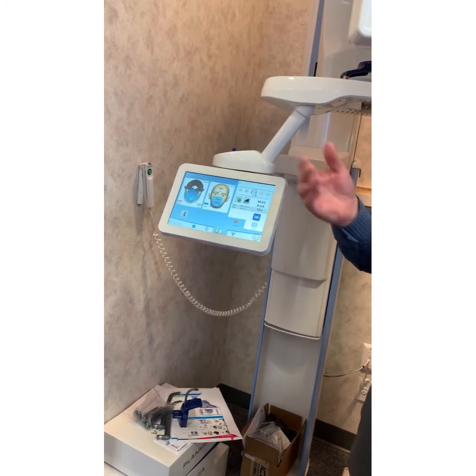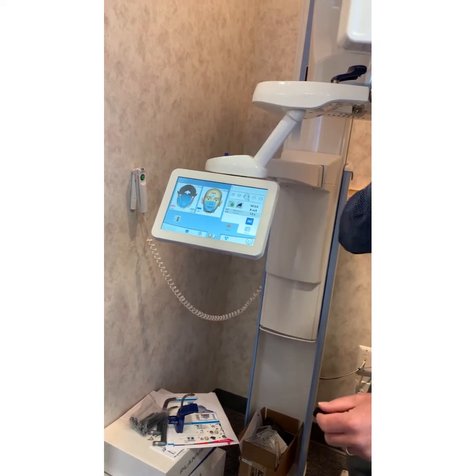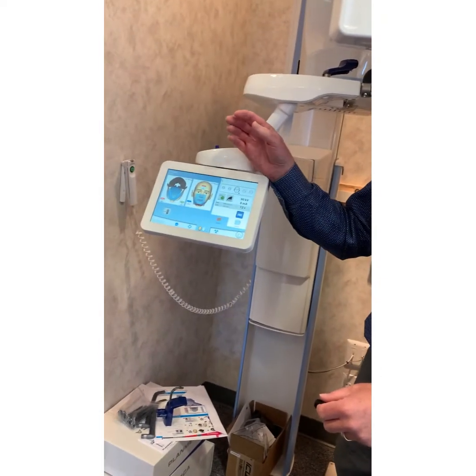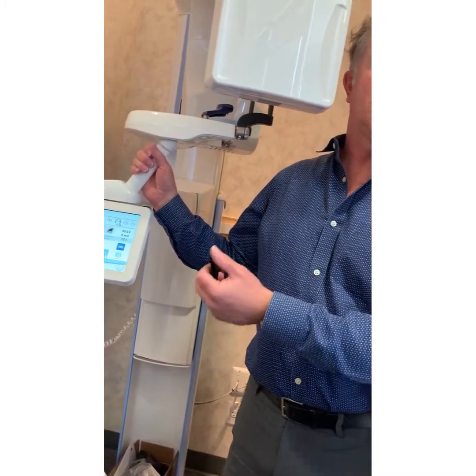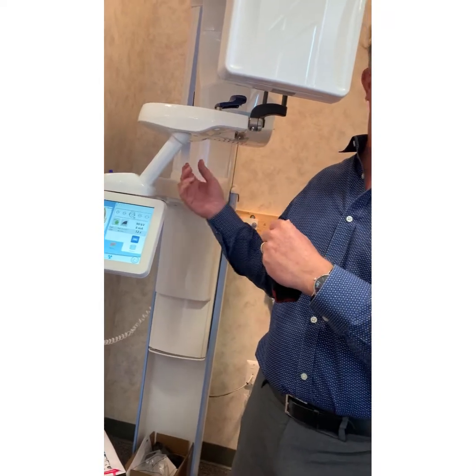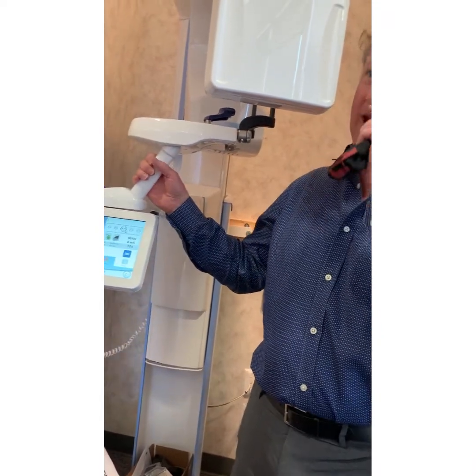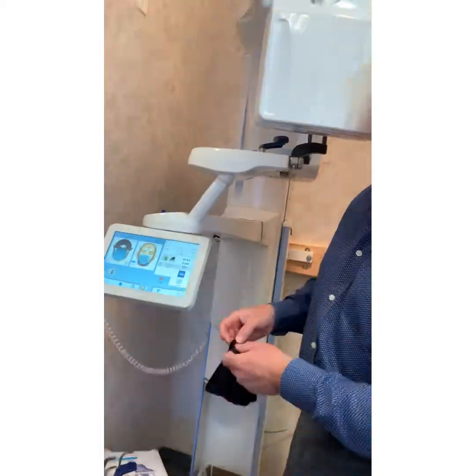But occasionally I get somebody whose perception of that, or how they talked about it in school, is just different. So when somebody says, "Can I see a fourth canal in normal resolution?" Well, I've got examples of that. However, it's a matter of the better you get at navigating through. You've already been using Romexis, so you know how to get through it. But the better you get at navigating and manipulating the image, the more you'll see. There's no reason you can't find all the treatable dentistry on every patient that walks through that front door all the time.